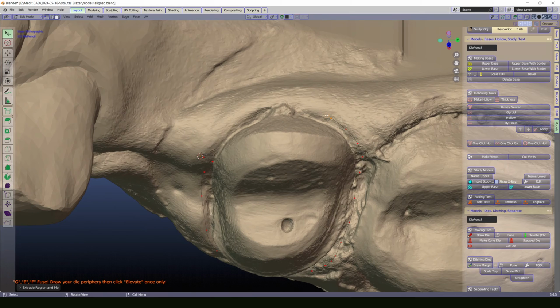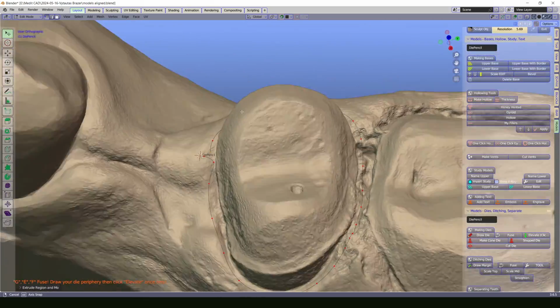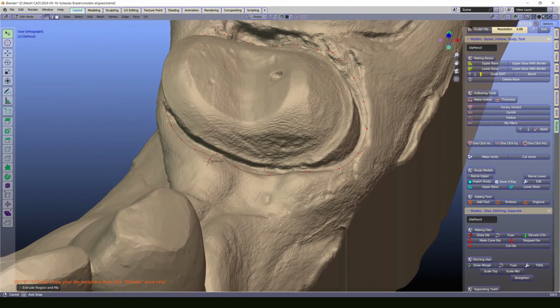You can navigate and move when you have laid down. With the E you activate a new segment of the line, and with the left mouse button, you lay it down, and only when you laid it down you can navigate, turn your model around and change viewing directions.